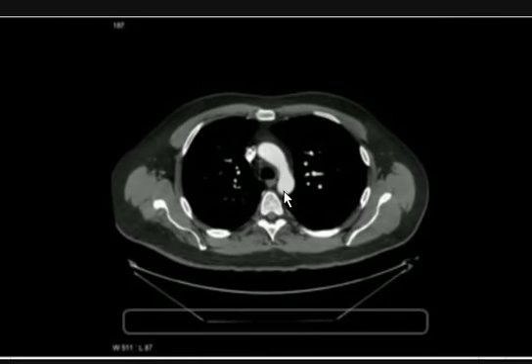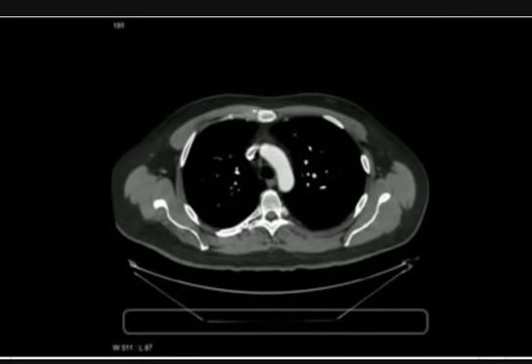So this is arch of aorta now, and thank you very much.